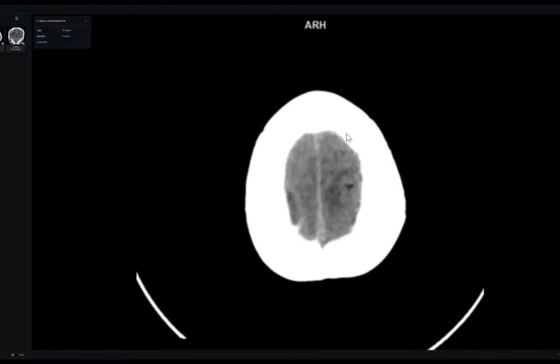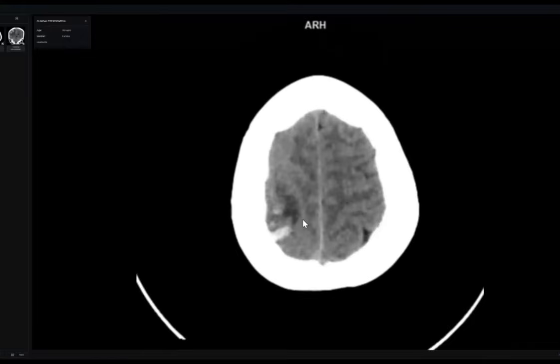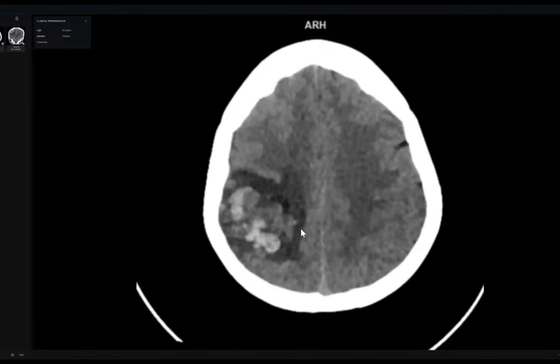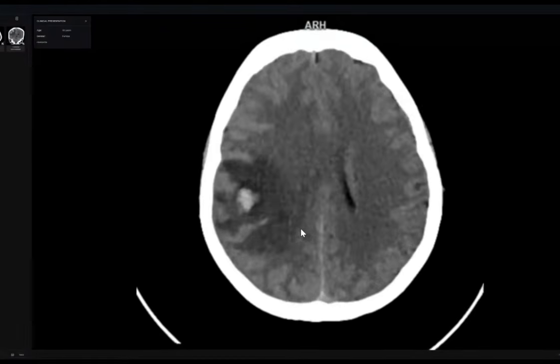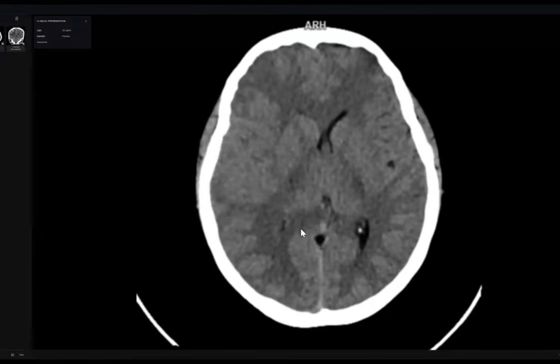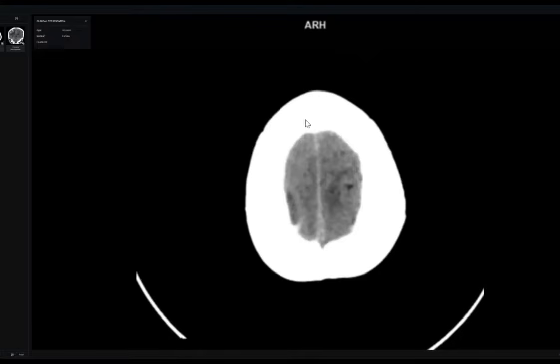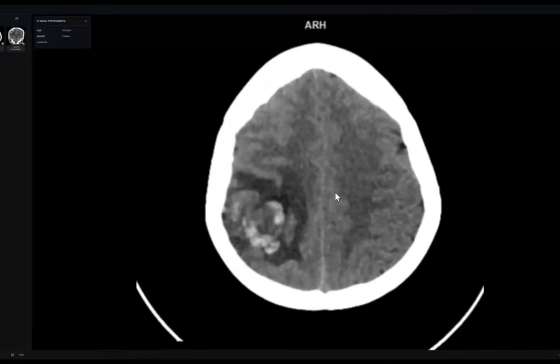Try to detect either a curvilinear structure like this, and you will run in the hemorrhagic venous infarction pathway, or you should detect any mass here. Is there any mass here? Frankly, no. So this is not a hemorrhagic metastasis or hemorrhagic space occupying lesion. Okay? If you didn't detect a mass and you didn't detect a curvilinear thrombosed vein or even a thrombosed superior sagittal or inferior sagittal sinus, whatever.